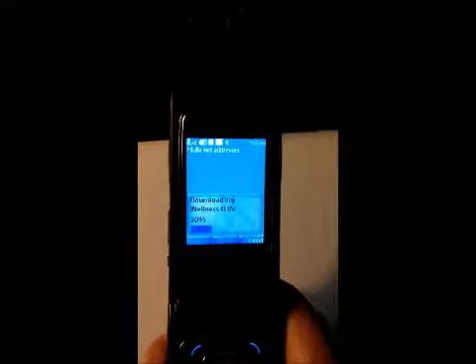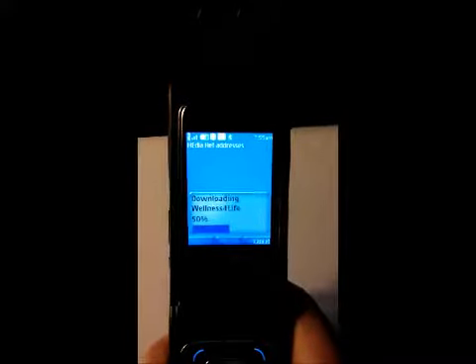We'll have to keep on waking this up for the battery life, which is being saved right here. So it's downloading it now from the internet, which is just going to take a minute or two depending upon the connection strength. Maybe not even a minute, but again, this can be used on any of the cheap feature phones, non-smartphones.